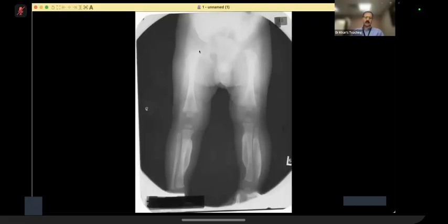With that, you have a thick periosteal reaction along the diaphysis, and it is not involving the epiphysis. With that, there are pertinent negatives. There are no metaphyseal erosions, no scurvy, rule that out. No Wimberger sign, Pelkan spurs or Trummerfield zone, etc. No cupping, as in rule out rickets. And of course, ask for a mandible, etc.